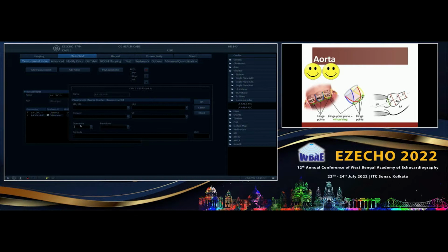Correct. Because you are using the area length method, you want A1 and A2, right, and the L. Now the important thing is that this A1 and A2 should be maximum, in the 4 chamber and 2 chamber. That is the way to go. And the LA axial length should be the minimum between the two, not the largest one, divided by small L.